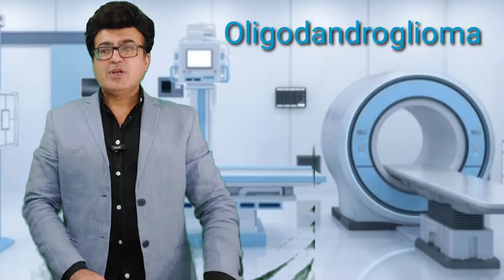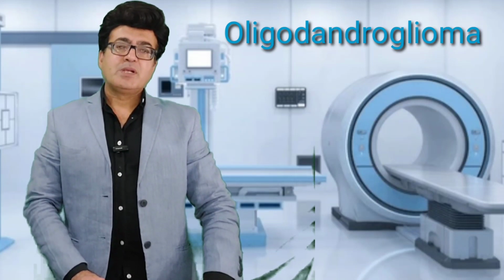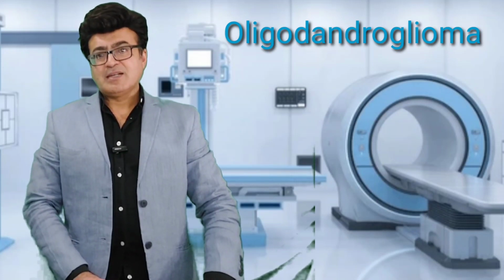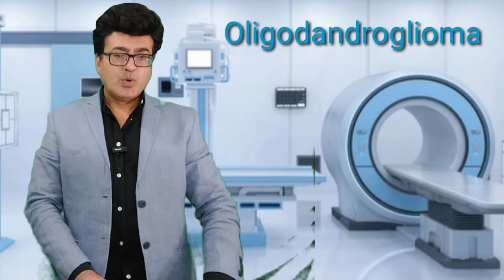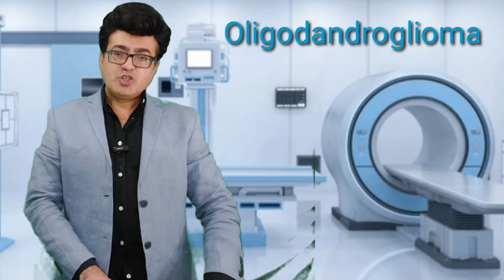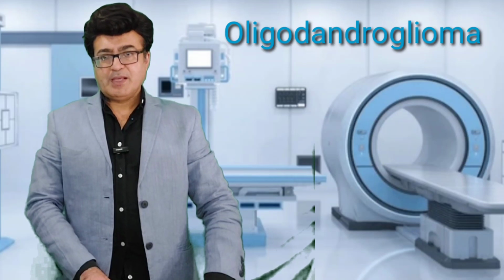Oligodendroglioma. Oligodendroglioma is an intra-axial tumor. It is a slow growing tumor. It is a benign tumor, and WHO classifies it as a grade 2 tumor, that is a low grade tumor, but well circumscribed. Grade 3 tumor would be a high grade tumor, and it would be anaplastic.